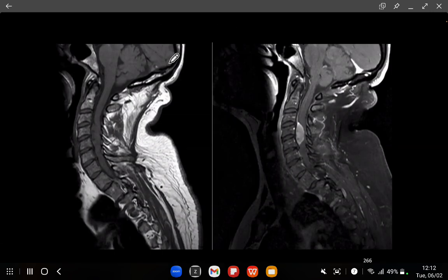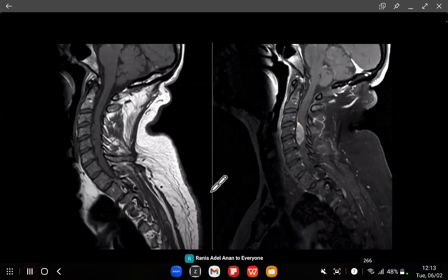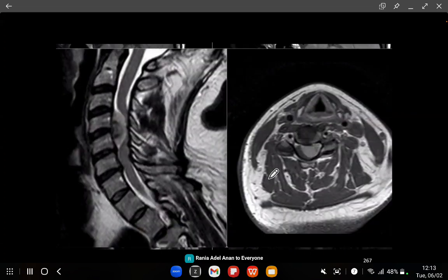Okay, we've got a lesion in the spinal canal. Yeah, it looks like a meningioma. There's the dural tail. Yeah, and it's an obtuse angle, flat based, and that dural tail, which is a telltale sign for somebody who's got a meningioma. And that's what it was.